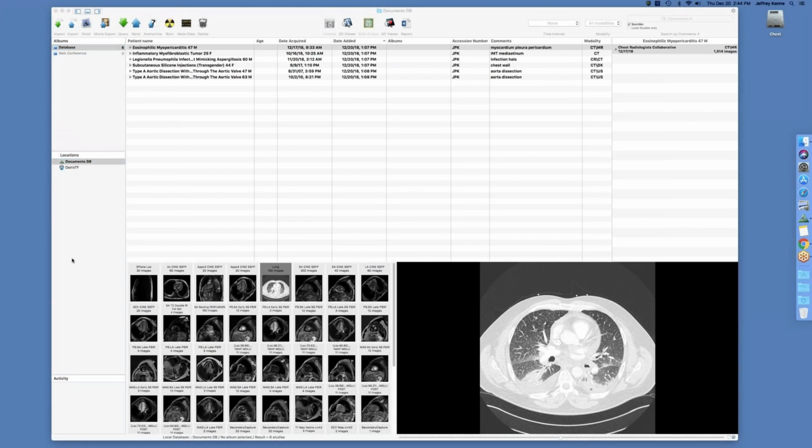All right. Well, I was hoping Seth or Travis would be on to add any commentary on that because I don't know much about it. But because I thought with the septal lines, you can see that with EGPA in the lungs, but it makes you wonder if that is reflecting more of cardiac involvement because it looks just like heart failure. Yeah. So, I mean, with EGPA, a lot of the people die of the myocardial disease. So I think this all fits nicely with EGPA so far.